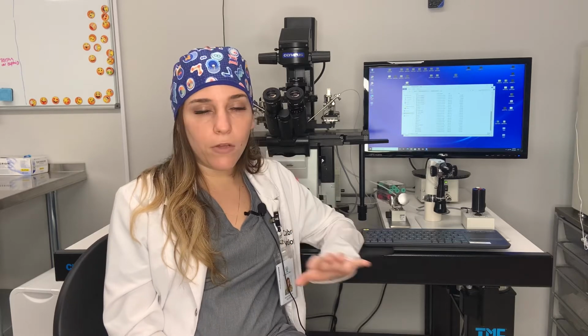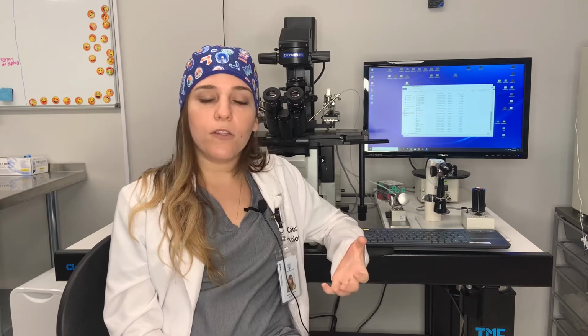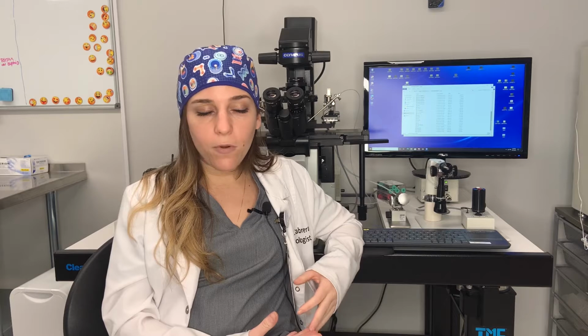So a fully formed blastocyst should have around 120 cells in the trophectoderm, and the ICM can't be calculated because it's just so compact that it would be impossible for us to count those cells. We use a system called the Gardner system. We did tweak it a little bit. We do something slightly different than the traditional way, but in order to grade an embryo accurately would be starting from day 1, where we look for the presence of the pronuclei.